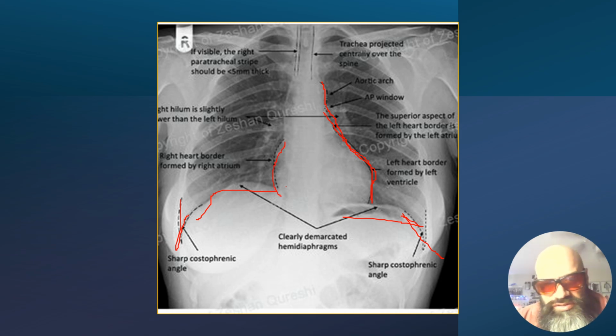So this is how you're going to get good at these chest x-ray evaluations. The more normal you see with these labels, you'll be able to get an idea of where everything is located. And it's a good way to quiz yourself, so that way you can orient yourself before you start making decisions of what you see or don't see on a chest x-ray.